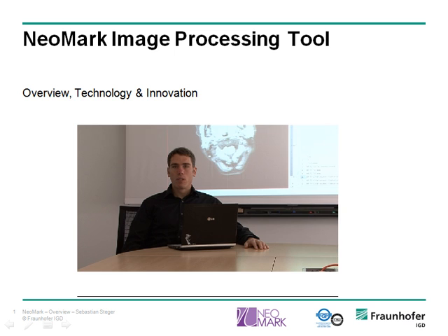In this video I will give an overview of the NeoMark image processing tool, give a brief explanation of the image processing and image analysis algorithms, and talk about the key innovations.